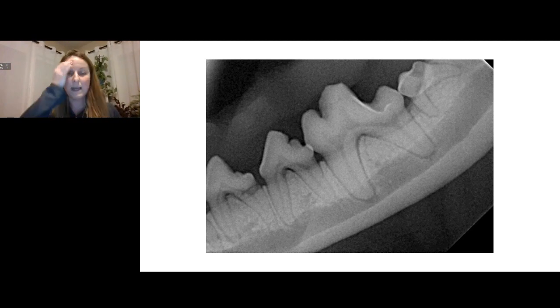So this is going to be a dog mandible. And the reason I put this in here is because we look at this right here and we might say, oh, you know what? Is that fractured, or do I have two different bone heights on either side of the mandible? So just keeping in mind that maybe you need to take another view.